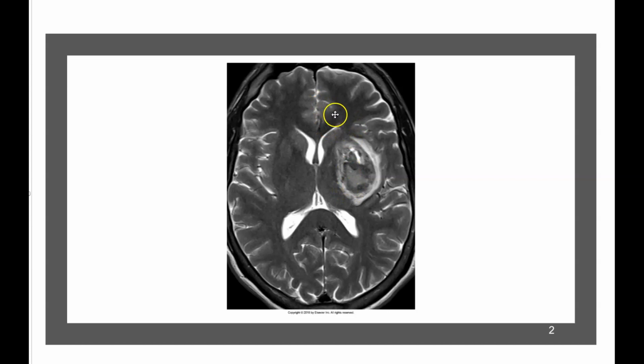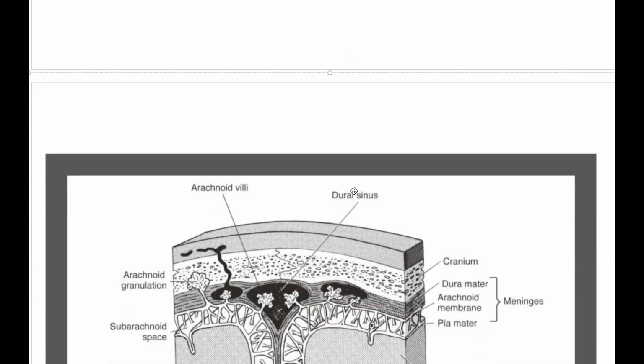And you can see we have what's called midline shift. So this line to this line here on your sagittal plane. You can see that it's shifted a little bit to the right. So we have some mass effect. It's called mass effect with midline shift. So that's bad.